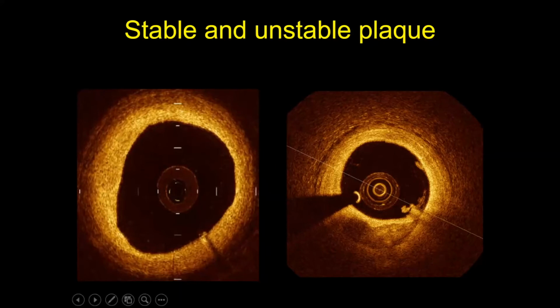I don't mind talking. What I can see on the picture on the right is what looks like a white thrombus there, possibly an area of calcification. But when there's white thrombus, it makes me think of whether or not there's a plaque erosion with white thrombus on there. Yeah. So otherwise, fairly circumferential fibrous plaque. Absolutely, I absolutely agree. I think that's what it is.